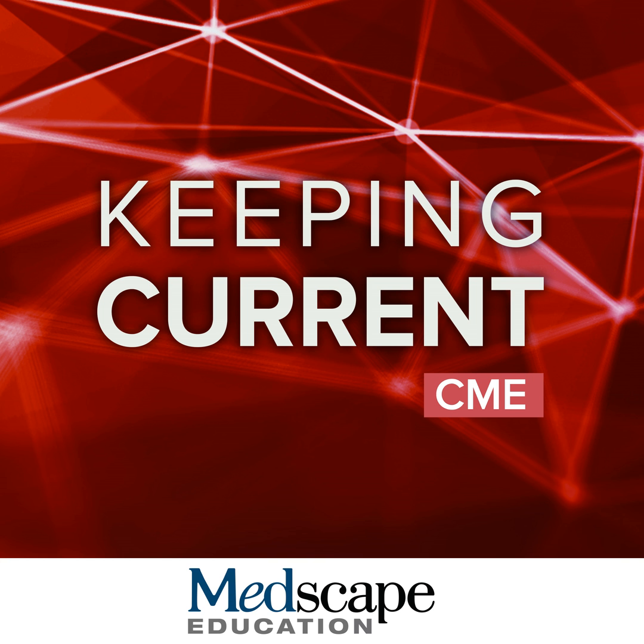Okay, let's talk about some clinical examples on what they look like with cardiac MR, particularly as it relates to ischemic heart disease. So first of all, let's look at the enhancement pattern post-gadolinium. Gadolinium agents are non-specific, but we can divide it into ischemic patterns of enhancement and non-ischemic patterns of enhancement. Ischemic patterns of enhancement are typically subendocardial or transmural, whereas non-ischemic patterns of enhancement tend to be intramyocardial, so mid-myocardial or subepicardial.